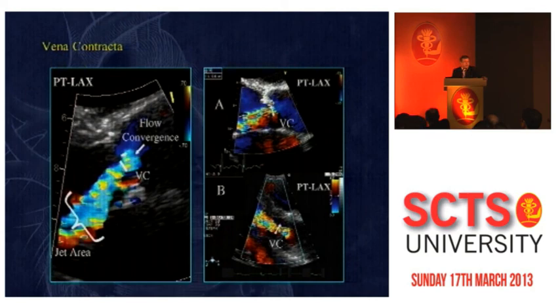And when you make the assessment from the apex using the CMR, so MRI, as the reference, you see that there is clear-cut underestimation of the regurgitant volume measured by the PISA method. And this is even more nicely shown here. If I only look at the central jets, you see that PISA and CMR from the apex are giving exactly the same amount of regurgitant volume.